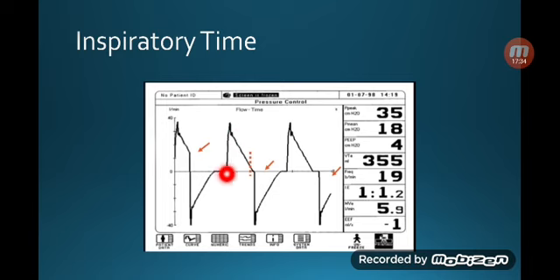Here, it's absolutely fine because no matter how much you increase afterwards, you're gonna get the same area under the curve. So you don't need to increase further, just enough to keep a safety net. Or if you're following your ventilator, you can just keep it here. But my point is, this is too short. Longer than that is going to be so long. So either here or there is right. Okay?